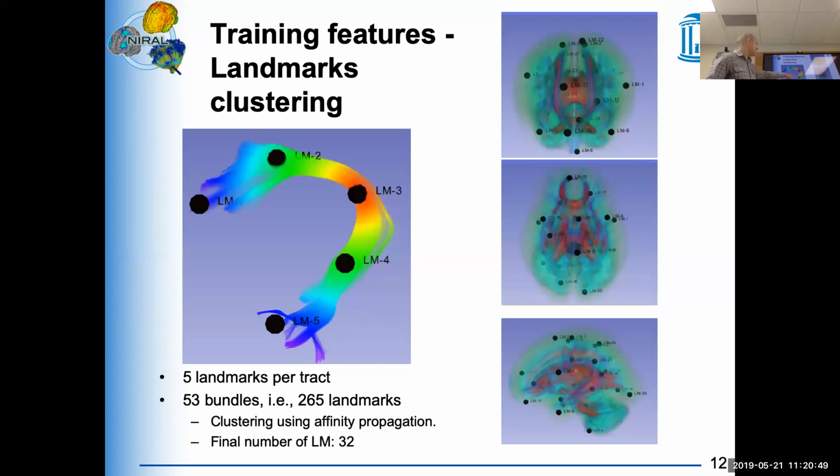And here you see actually distance to landmark 3, because this is the closest. You see red, and the blue is further away. And so it determines these landmarks automatically during the training phase. Now that would be if we were to train an arcuate-only classifier.